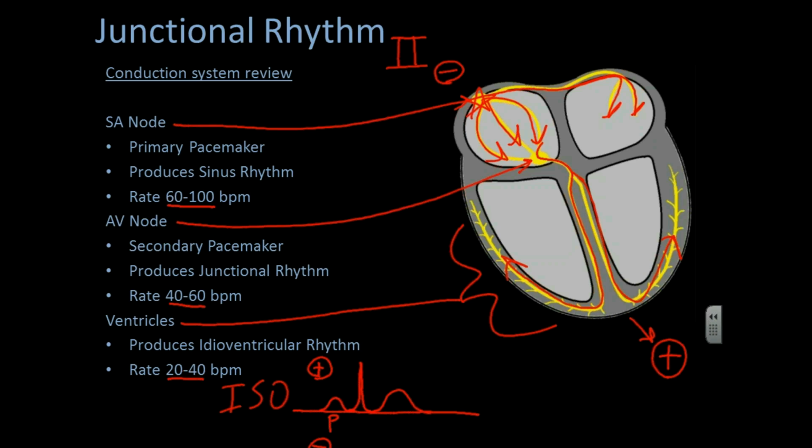Now, on the ECG paper, you will see large boxes and small boxes. Just as a review, you can see the large boxes like that. And I will draw another QRS on here, just as an example.